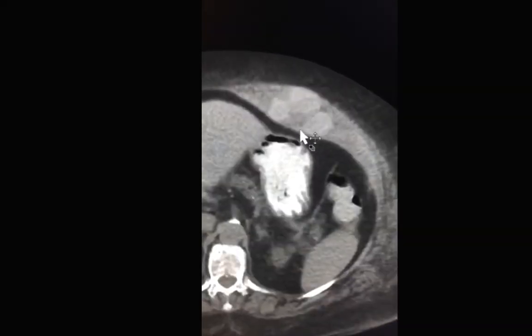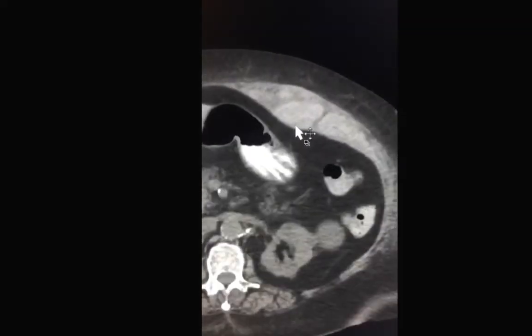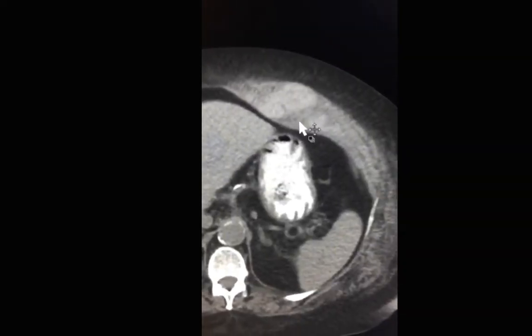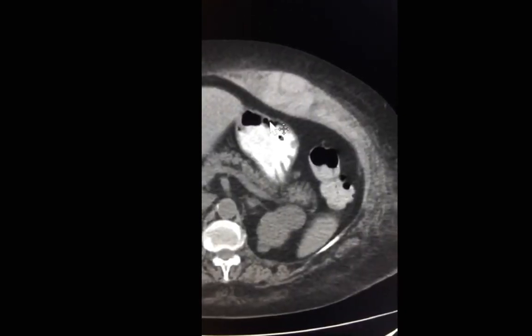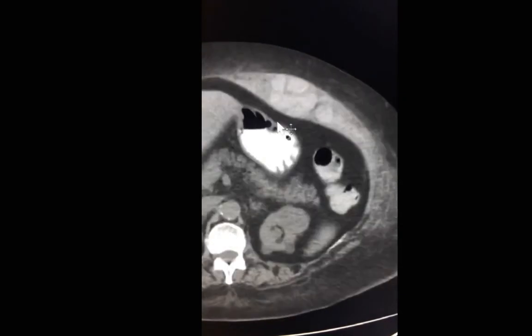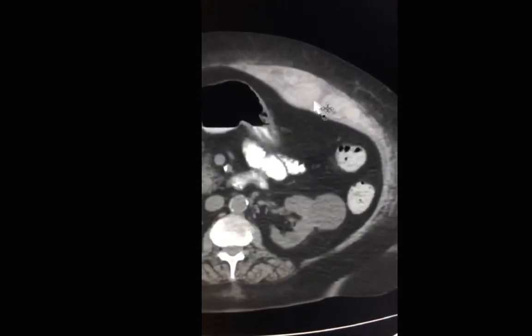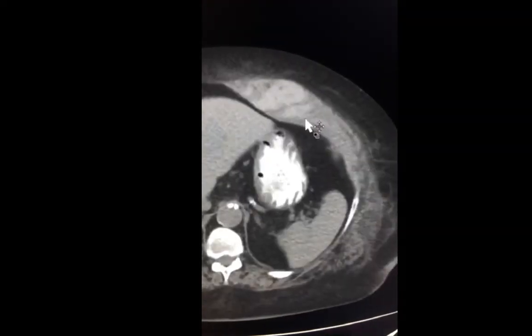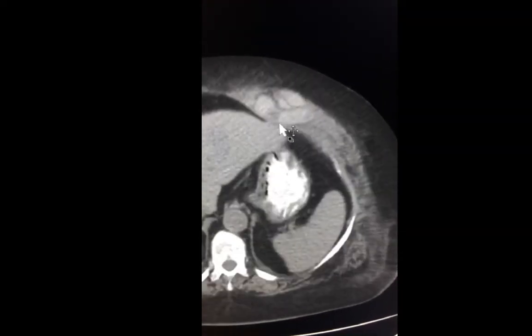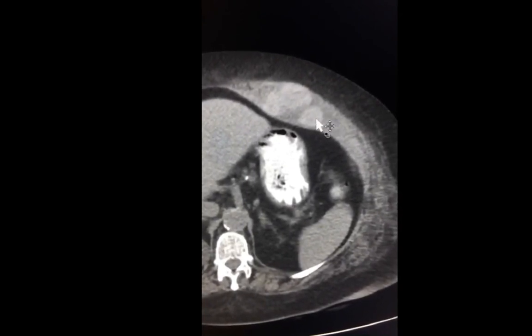Although rectus sheath hematoma may be related to trauma, it could be spontaneous, especially in patients on anticoagulation. So this is a nice case of acute hematoma in the left rectus abdominis muscle that should not be confused with malignancy. We know such an abnormality may be spontaneous, and from an imaging point of view, blood on a non-enhanced study may appear bright.